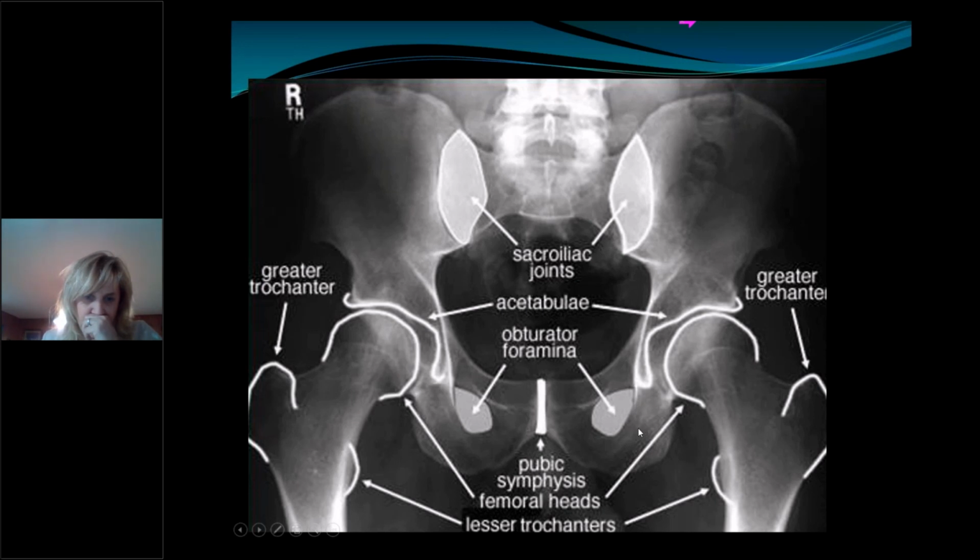Think about it like a lifesaver. Lifesaver, you can't really break it in one spot. So if it's a ring, which this is a pubic ring, usually if it's broken on the superior, it's going to be broken inferior. Those are okay to ambulate on.